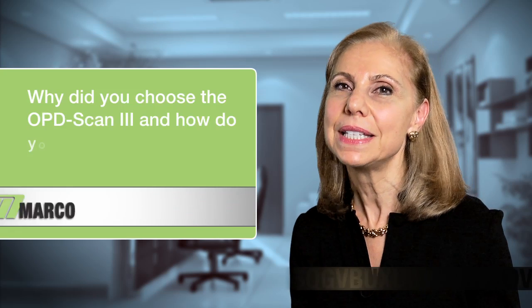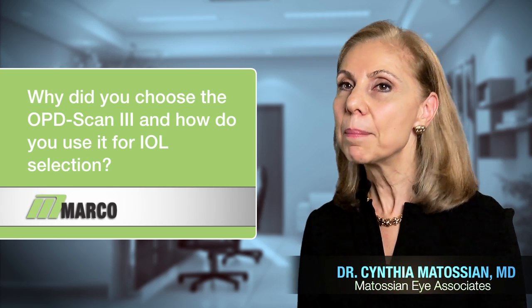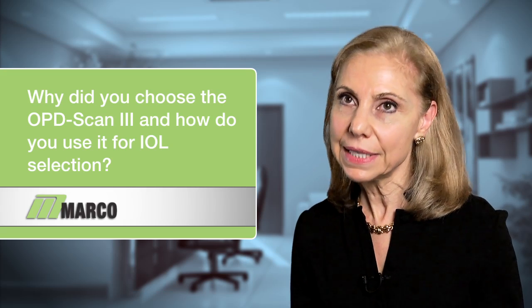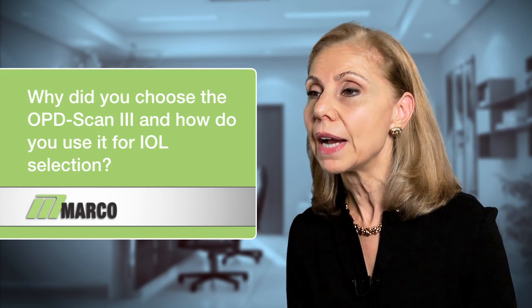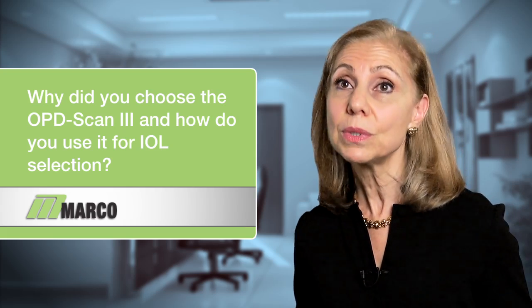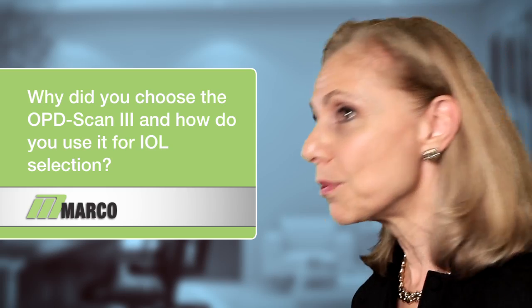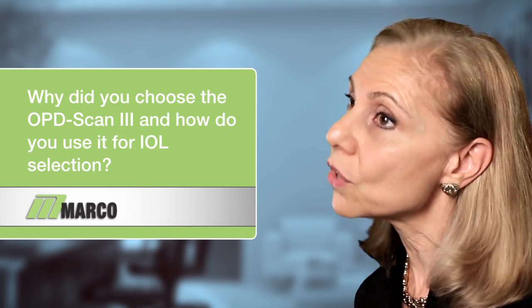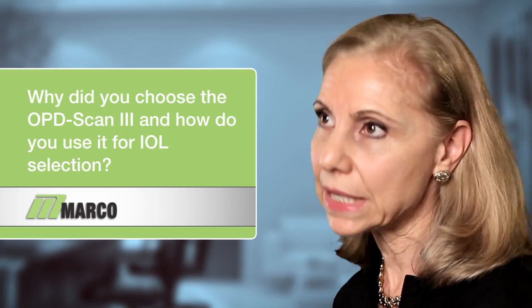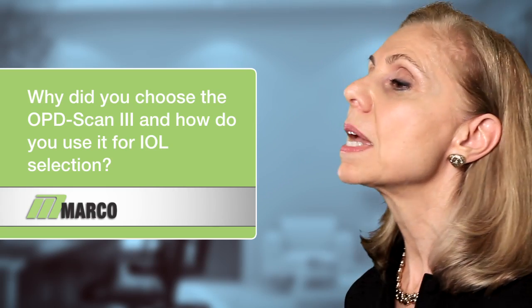I use the OPD to help me best customize the implant to each patient. By looking at the data that the OPD-III provides, I can select which implant best suits each of the eyes of the patient. Sometimes we use a different implant in one eye than in another eye. It all depends on the eye's quantitative numbers that I'm able to obtain from the OPD-III.